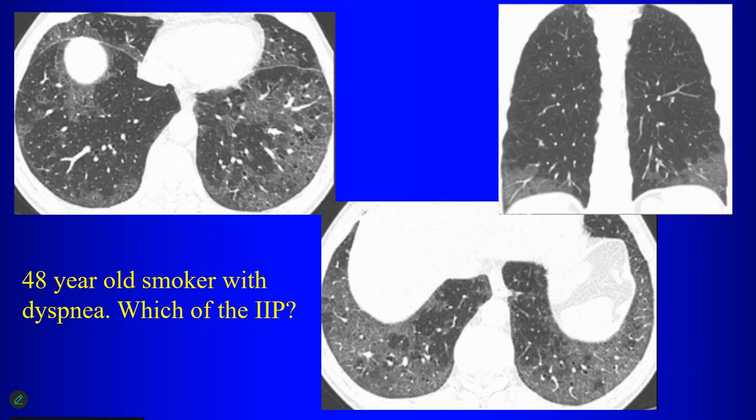By the way, what do you have to tell me about that term, DIP? What does that mean, desquamative interstitial pneumonitis? What does that term mean? When we use that terminology, we're implying that the abnormal opacity is from what? Pneumocytes. Desquamated pneumocytes, right?